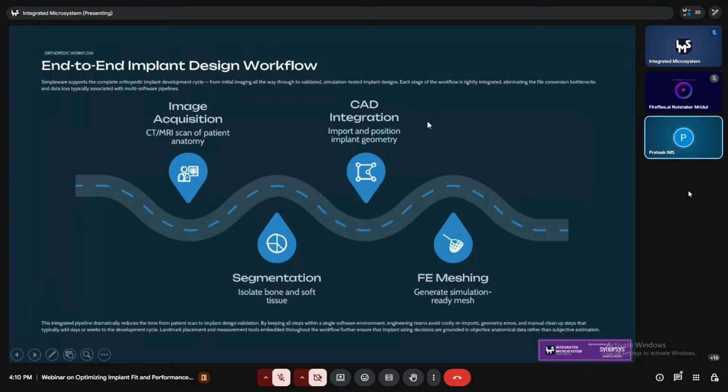So I was talking about the CAD integration. In the case of hip replacement surgery, we have basically this acetabular cup, and other than the acetabular cup, we can use a ceramic metal ball in the place of the cup. But today, in this example, we'll see how the acetabular cup helps us in implant fitting, and we'll see the pre-processing before fitting the implant.